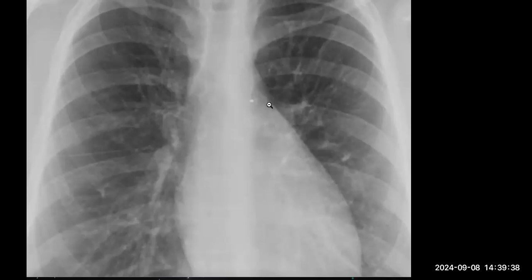No. Usually in a cardiac post-surgical patient, any opacity could be either leads, or sternal sutures, or any valves. Correct, any valves. So this patient had Eisenmenger syndrome, for which this valve was put. Can you connect and tell me where the possible valve could be? In Eisenmenger syndrome, this could be in the pulmonary artery or the pulmonary valve.